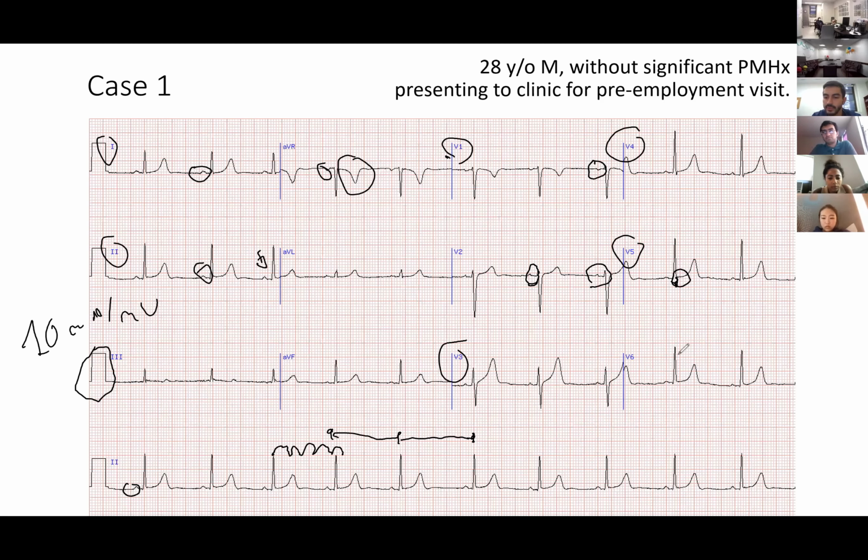So that is important because that's where you measure if there is ST elevation or ST depression. From there you check your ST, meaning if it is elevated or depressed, you're going to see if it is upslope, downslope, or straight. All of those are different and important to differentiate once you're talking about whether this is ischemic or not.